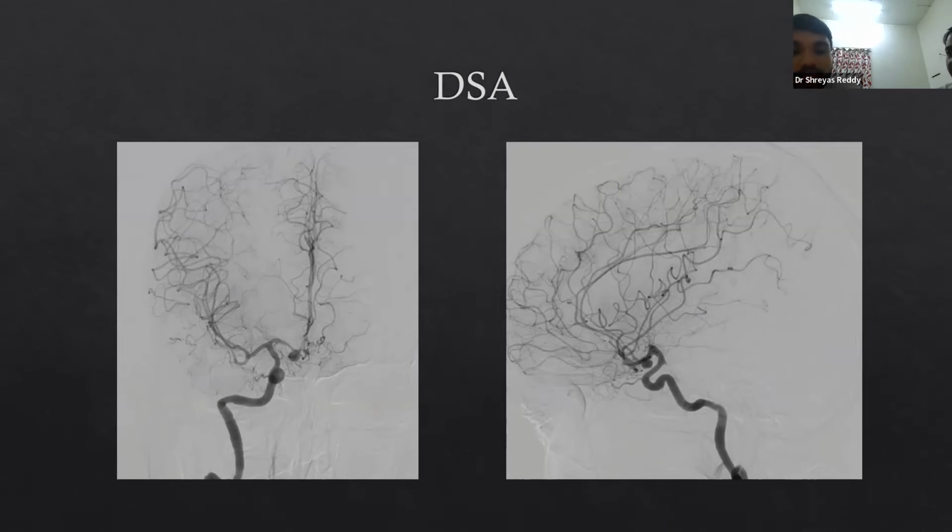There might be multiple aneurysms in the brain. How do you tell that this is the one that ruptured? It is the teat and the daughter sac. Okay, that is one thing. What very bad thing do you see in this image, which has happened to this patient?